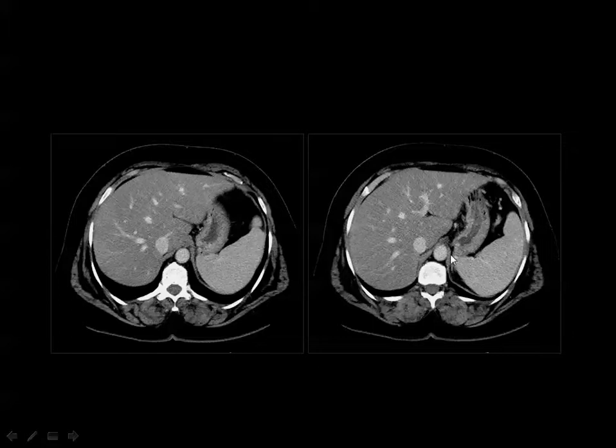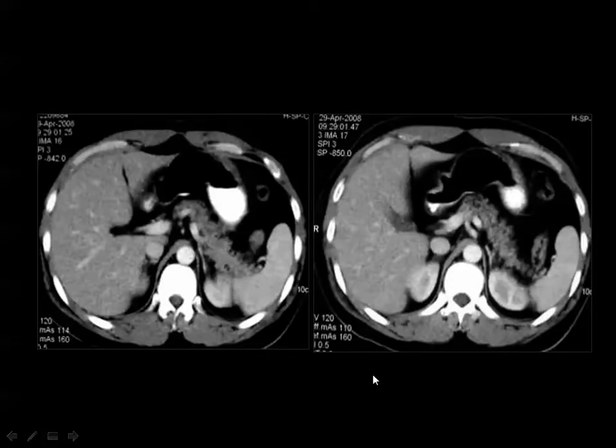The left crus is relatively thinner compared to the right one, and they surround the aorta, as you can see, and this is the spleen, and this is the stomach. Lower down, you will see the pancreas, and here is the pancreatic body and the tail, and this is the spleen, this is the stomach containing some of the orally administered contrast media, and this is the liver, this is the aorta, and this is the IVC, and here you can see the upper pole of the left kidney.